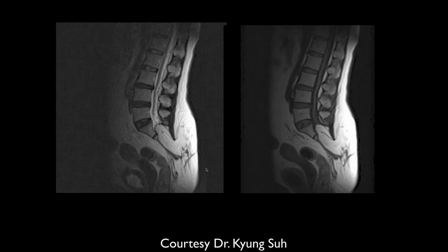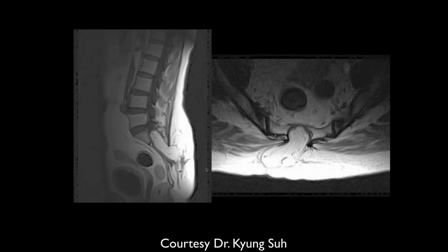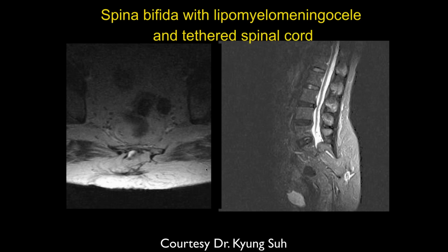Yeah, the fat extending into the defect. Okay. So what would you call this? It's lipo.